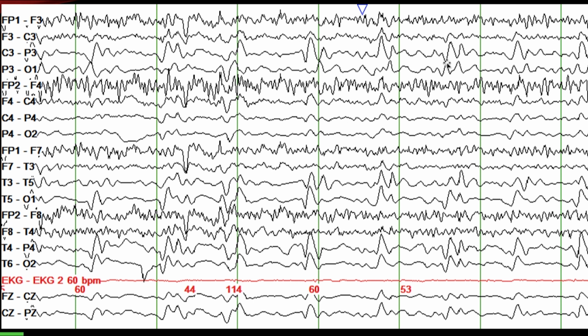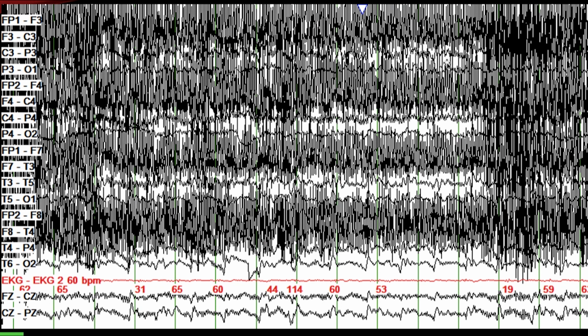Another key thing is making certain that you compress the EEG and look over the EEG again. On this particular slide, I'm looking at 30 millimeters per second, and then I change it to 15 millimeters per second. If you do not use proper filters, you're going to miss the characteristic findings of CJD, which are the periodic sharp wave complexes.